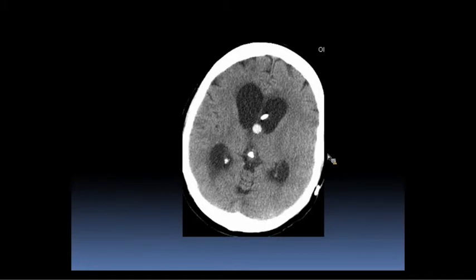Of course, you can have non-neoplastic things also giving you hydrocephalus. This is a colloid cyst. So if you see a small non-obstructing colloid cyst, you still want to monitor it and get a neurosurgical evaluation, because these can very quickly give you hydrocephalus.